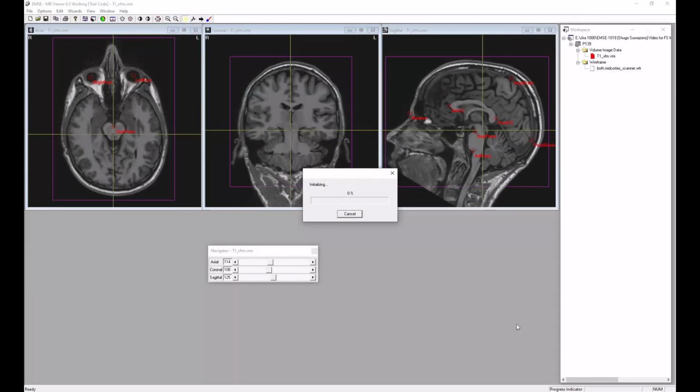Okay, this one might take a little while. So while this is processing, I might just describe a little bit what it's doing. So it says make convex hull using shrink wrap. So we're taking all the brain, including cerebrospinal fluid, white matter, gray matter, and making basically an envelope around it, but one that's convex, that doesn't have any indentations.